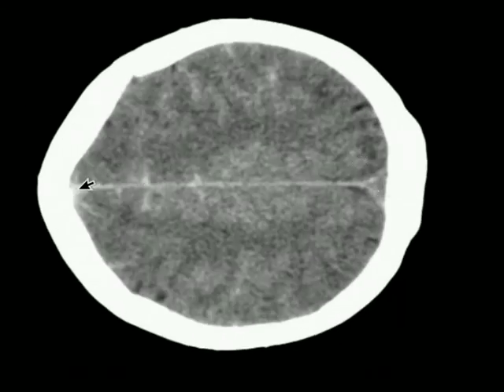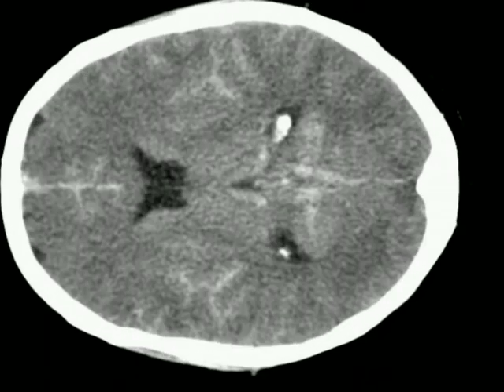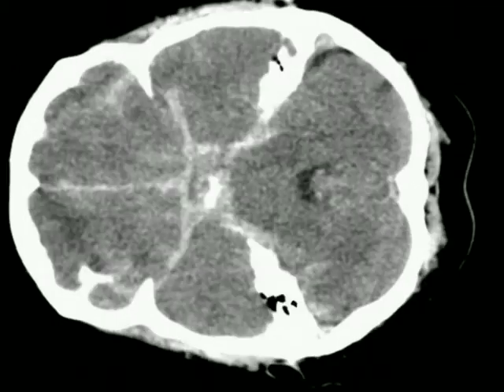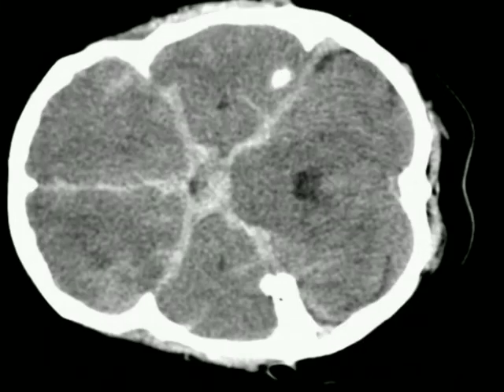This is a CT of a subarachnoid hemorrhage. Working from the top down, we can see hyperdense areas in the hemispheric fissures. And as we work our way down, we can see more hyperdense areas in all of the fissures, into the basal cisterns. And so this would indicate the presence of blood, so a subarachnoid hemorrhage. And this can be due to trauma or they can be spontaneous.